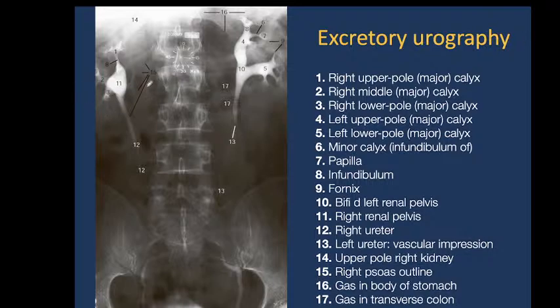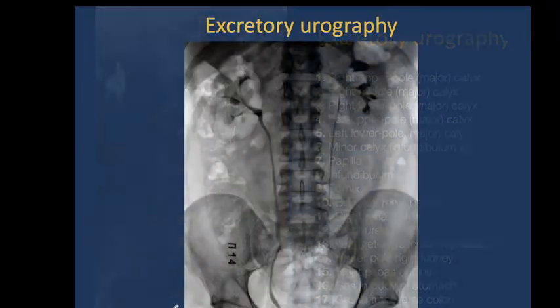I explained already how they use it, and it is visible the renal pelvis, which has a different form, right and left kidney, different shape of the pelvis, and ureters with a portion of the urine, and the urine inside of the urine bladder.